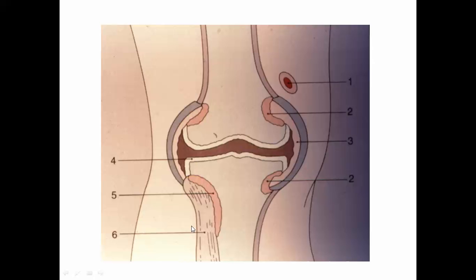This is a typical example of rheumatoid joint. Rheumatoid joint, you will find the erosions, which we call periarticular erosions, due to ingrowing pannus or ingrowing soft tissue inflammatory process. We can get synovial thickening, we can get subcutaneous nodules, and the cartilage will be eroded, some parts of it will be eroded, and there is periarticular soft tissue swelling.